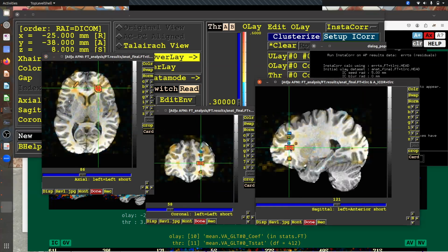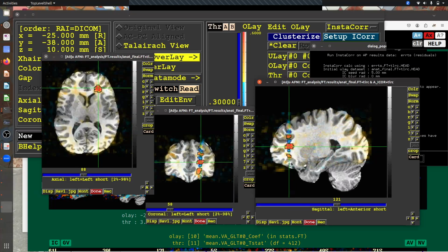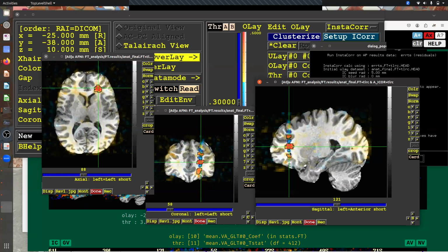If I come up here, let's see, yeah. If I look for correlation here, I'm in white matter and I see something that's highly correlated then anti-correlated, like a step ladder of correlation and anti-correlation. This is something a little bit weird and non-physiological. Through some QC projects we've come to realize it exists in a surprising amount of data and is something you don't want to see. This is a scanner problem that's actually happening in the data.